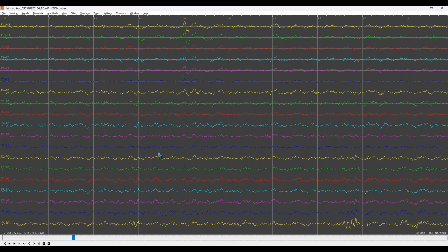But you can't do any editing in here. This is more just for visual, to go back and look to see what happened.